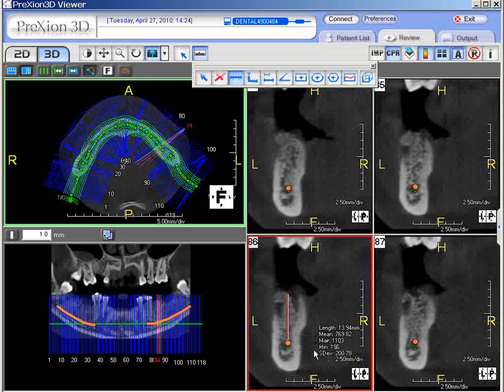actually measure the measurement here. And once you perform that, then you could go and perform your secondary measurement and give you an opportunity to know approximately how much of the length that you wish to put into this section here. So just whatever one wishes to do and use. So that's the beauty of dropping in the orange dot, marking the canal, and doing your measurements here in the CPR mode.